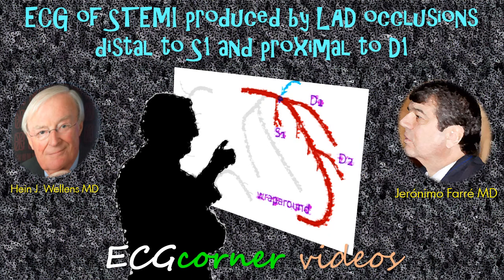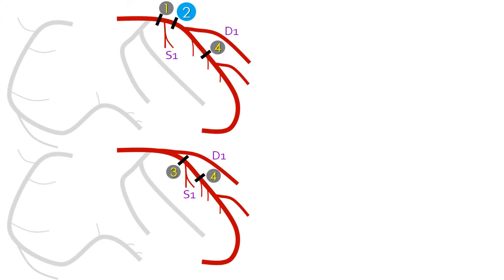Hello, we have prepared this video to explain the electrocardiographic expression of obstructions in the left anterior descending coronary artery that are located after the first septal branch and before the first diagonal branch. As explained in previous videos, in ischemia produced by an occlusion of the left anterior descending coronary artery, there are four major locations of the obstructions, each of them resulting in a characteristic electrocardiographic pattern.